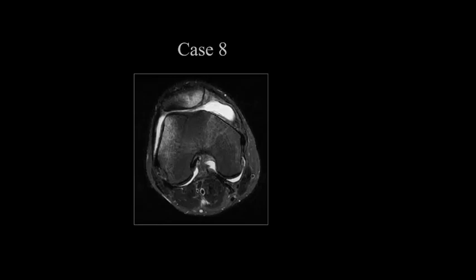Yeah, so this is a prior lateral patellar dislocation. Probably the only thing you need to add is the presence of joint effusion. Okay, mild joint effusion. Yeah. So bony contusion involving the medial surface of the patella and the lateral surface of the lateral femoral condyle.